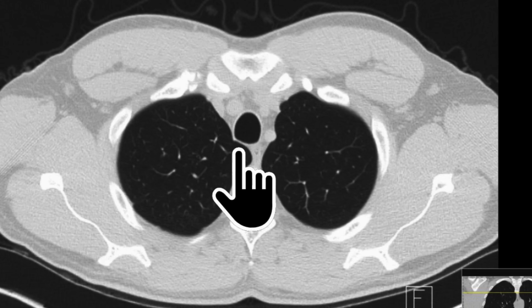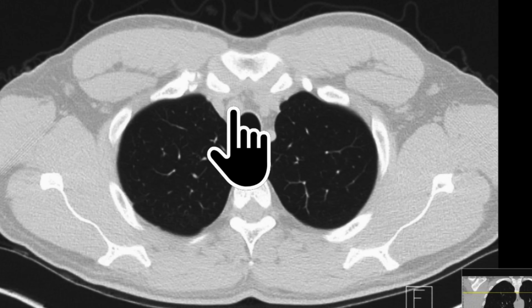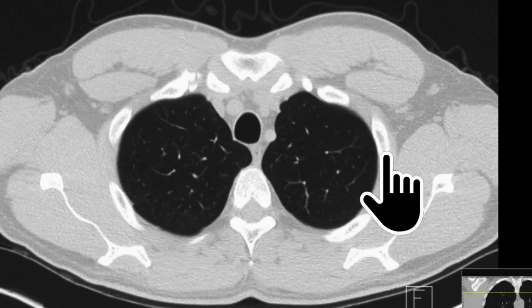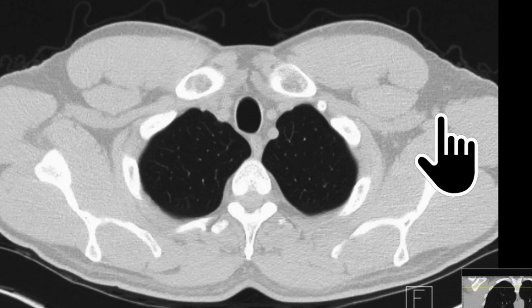All right, so if you have a section at this level, I'd like you to be able to recognize the trachea and then see these 3 pretty well defined circles closest to the trachea as being arteries because they're deeper than the veins. And then think, well, brachiocephalic trunk first, then left common carotid artery, then left subclavian artery. Boom, boom, boom. All right? Look what we can see. And the veins are closer to the bones. Pretty good.